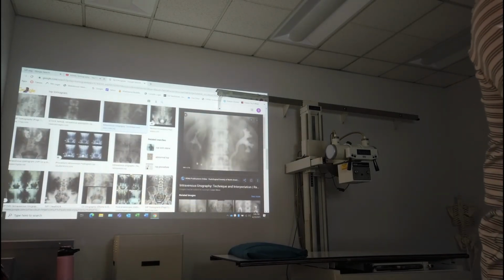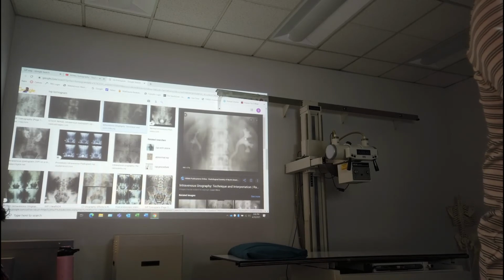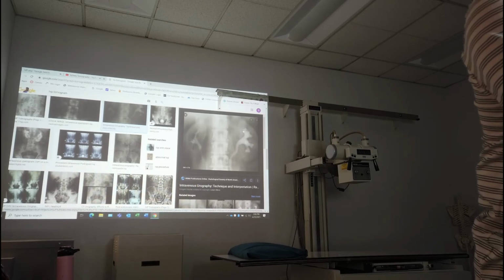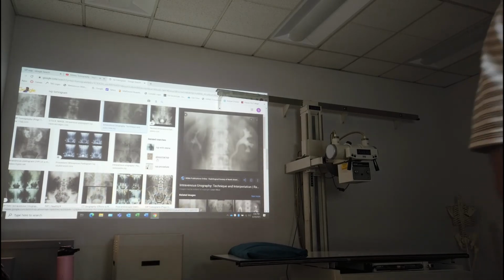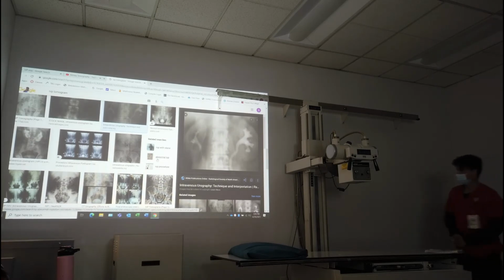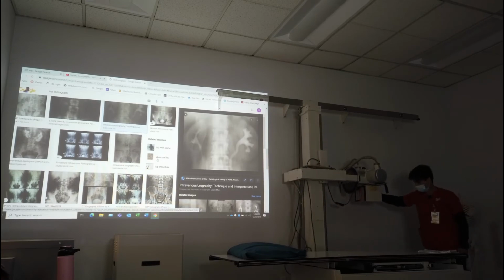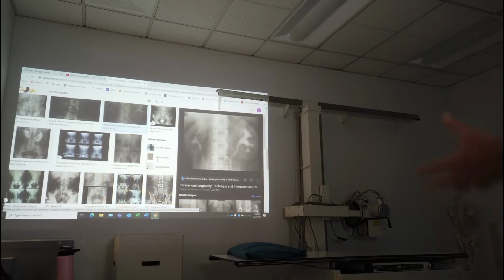You can see how it's kind of fuzzy, it's kind of blurry to me. But when you look at the renal pelvis and the kidneys and all this stuff, they're actually super clear. And you can see the spine is pretty clear. It's actually better on my computer. But you can see like the outer margin of the kidneys and the calyces are pretty darn clear.